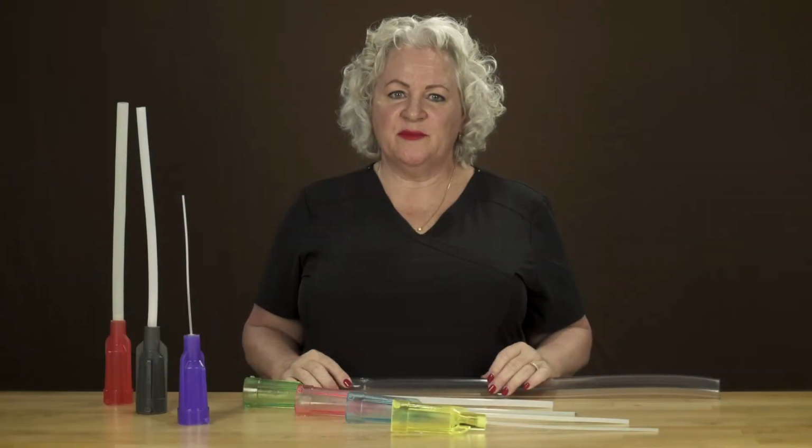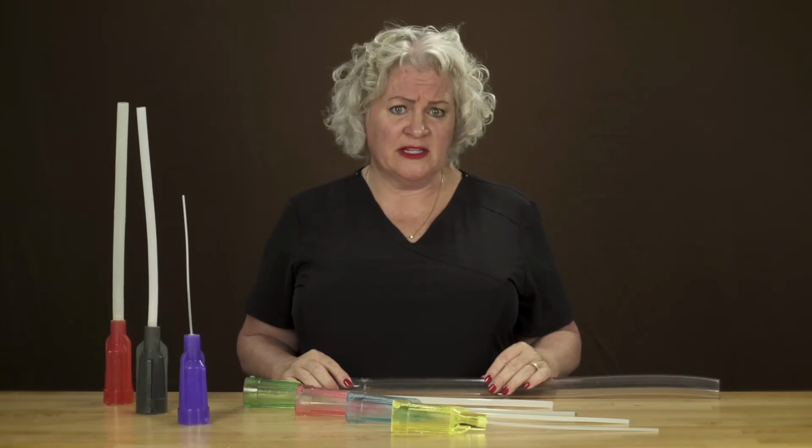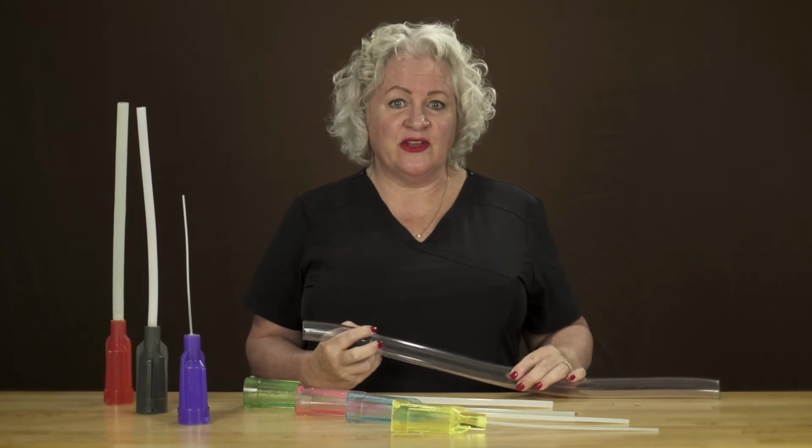The Cannulation Simulation tool is a visual aid to help clinicians understand the concepts that cause peripheral IV failure. When we discuss these concepts, they're abstract and difficult to grasp. These demonstrative tools provide the aha moment for the clinician and will help them to make better choices with device and site selection.